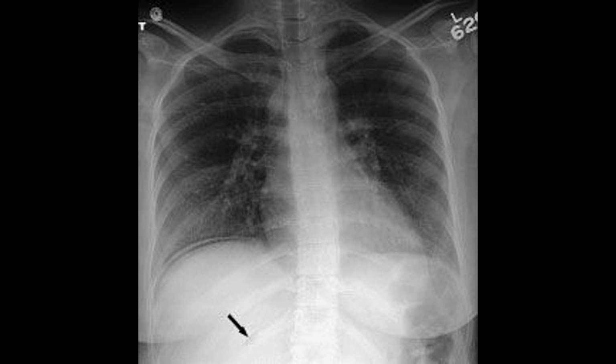Several other radiographic signs of pneumoperitoneum can be seen on chest and abdominal radiographs. These include the continuous diaphragm sign, in which gas outlines the entire diaphragm across the midline, the Doge's cap sign, as seen here, generalized increased lucency over the liver, the Rigler sign, where both sides of the bowel wall are outlined by gas, and the triangle sign, representing small pockets of gas trapped between loops of bowel within the mesentery.